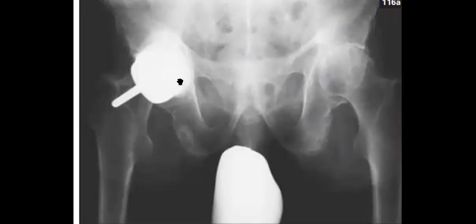Okay, so at least the sacroiliac joint here, you don't see them, but with this at least the dagger sign, and you will suspect that there is fusion, right? And there is interspinous ligament ossification as well. And here some arthropathy in the symphysis pubis. So ankylosing spondylitis.